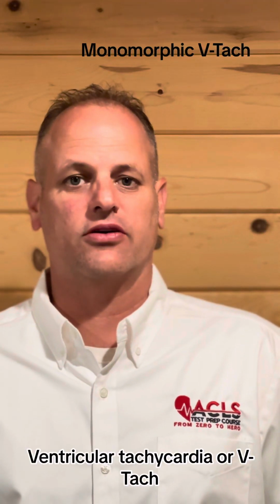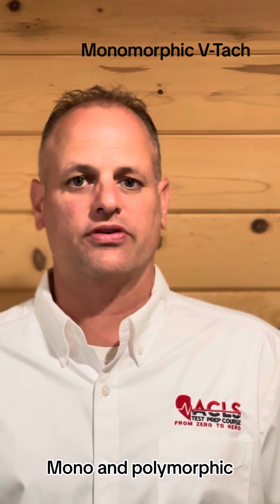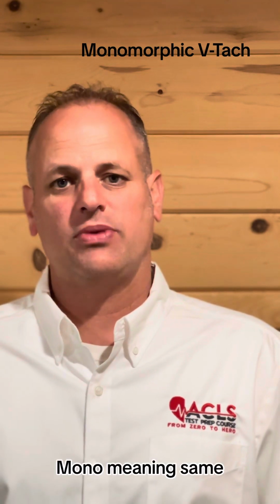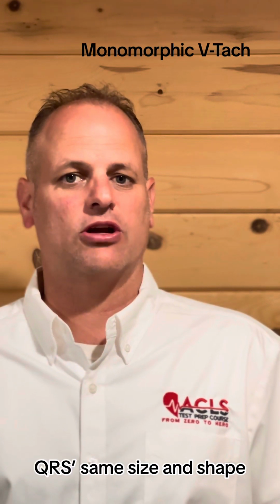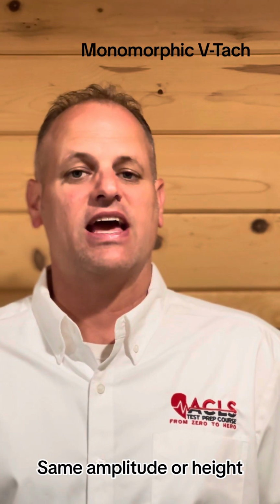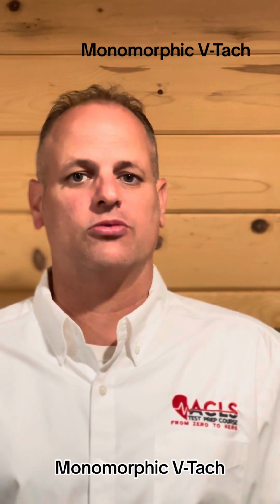Ventricular tachycardia, or V-Tach. There are two different types, mono and polymorphic V-Tach. Mono meaning same, morph meaning shape. So the QRSs are going to be the same size and shape and share the same amplitude, or height. So we're going to go over monomorphic V-Tach first.